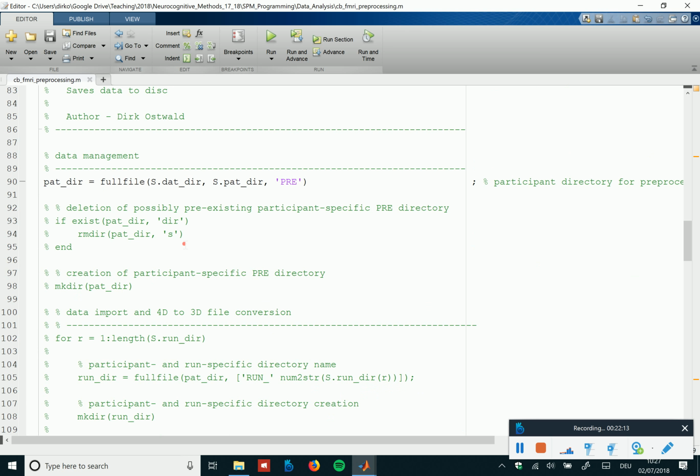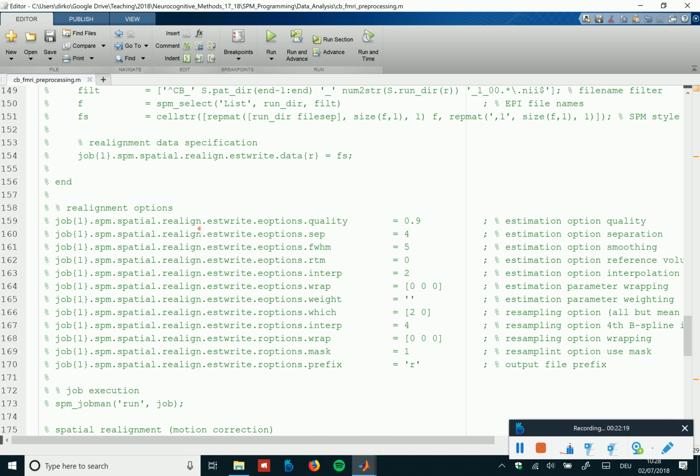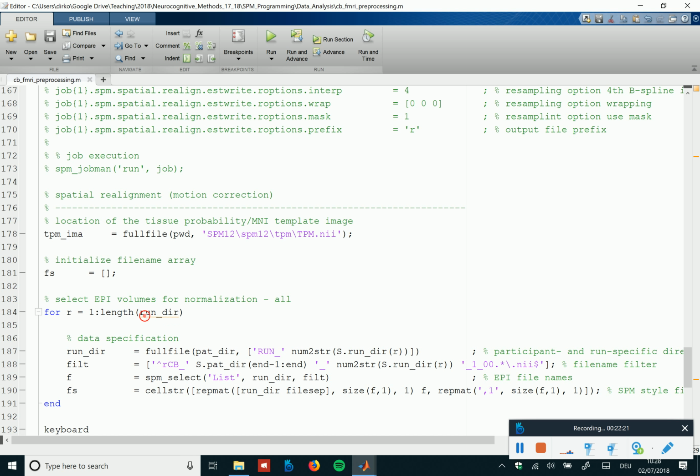This is from copying the code. So we made it better than in the old script because we defined a structure, and that was there.